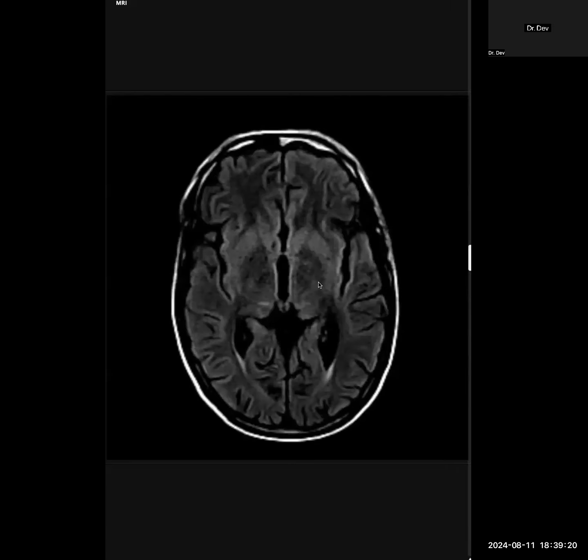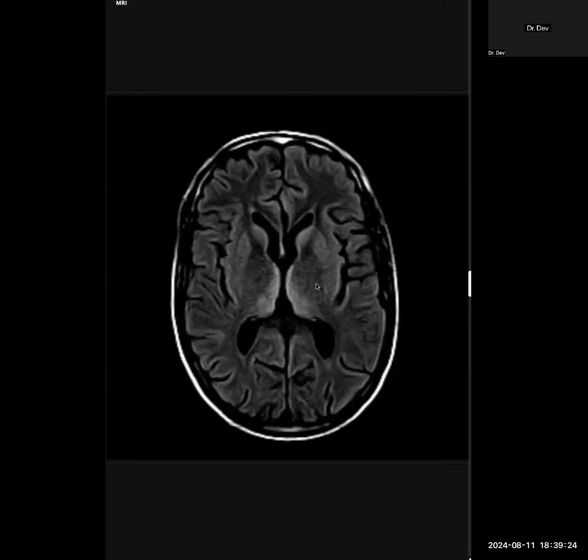This one, I specifically kept this case because, and this goes for anyone who's listening, these days I prefer that when you're talking about these cases, call it thiamine deficiency. That's the diagnosis, and not Wernicke's, because you can then.